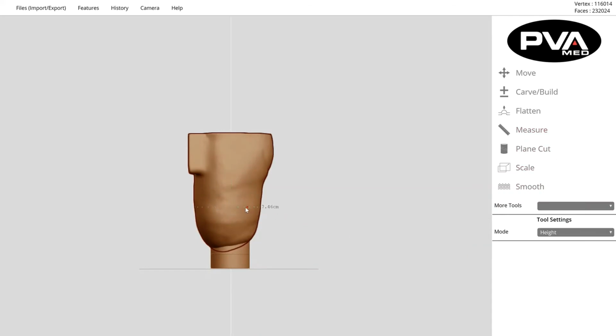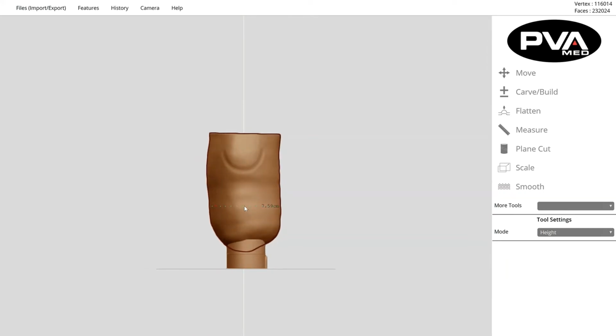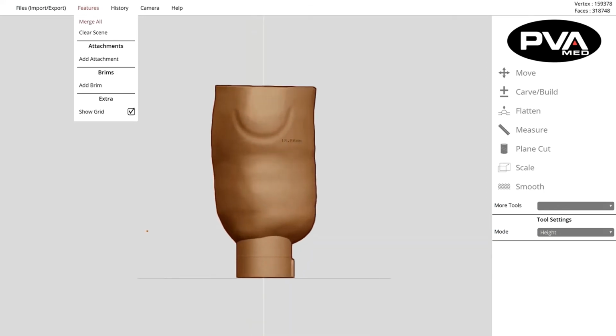And having a proper alignment, as you know, is super important. So being more judicious at this point in the process pays big dividends later on. So I'm going to do hopefully one last movement here. We'll do one last measurement, hopefully. And if things look like they're centered and on point, then we're going to check our distal and go ahead and merge that right into the positive model. So now those are one object.